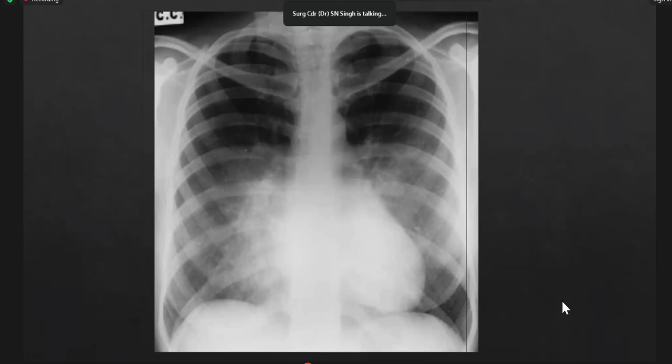It is so. How do you see the history? History of frequent fever, cough, all that. Then it is on the infective side. An asymptomatic patient walking to you, and this most likely it is pectus excavatum. What do you think? What do you look at in pectus excavatum?